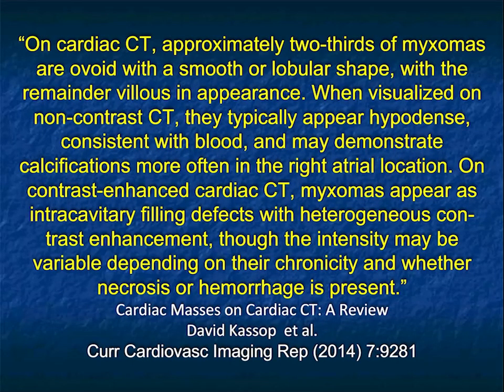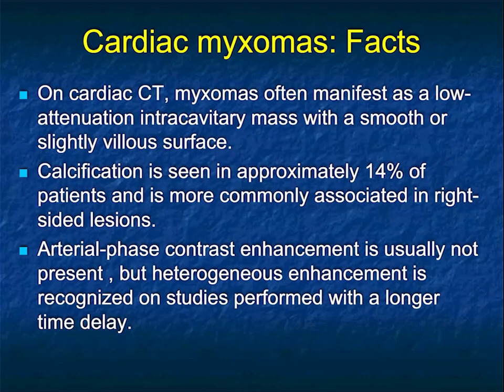This article by Kassup, they also make the point that the majority, more than 2/3, are smooth or lobular shape, with the remainder villous in appearance. When seen on non-contrast scans, they're hypodense, consistent with blood. Occasionally, they'll calcify. On contrast-enhanced scans, they're shown as intracavitary filling defects with heterogeneous enhancement, but the intensity of the enhancement is variable, but it's not what I would consider hypervascular. They're often these low attenuation, smooth lesions.